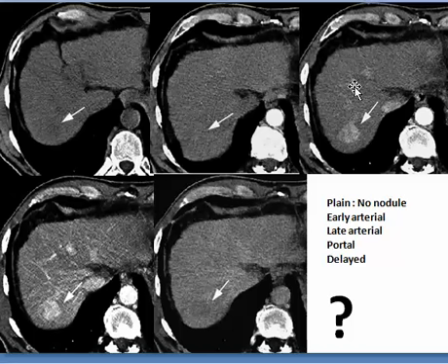Now in this one we have a hypointense area which starts to enhance in early arterial and arterial phase, while it starts to fade at the margins in the portal or venous phase, and in delayed we regain its hypointensity compared to the liver.